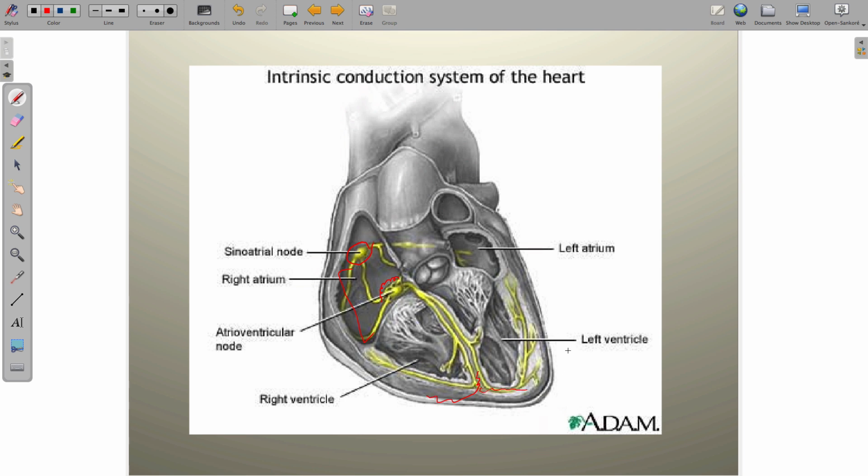So now we're going to look at something a little bit different. Sometimes the heart is actually working in terms of its pacemaking capability, but what's really happening is that there's a level of dysfunction either just below the AV node, so infranodal, or inside the AV node itself, that's preventing either a sinus impulse or an atrial impulse from communicating down to the ventricles. And when there's some sort of blockage of electrical signal, either infranodal or within the node, then we're going to refer to that as heart block.